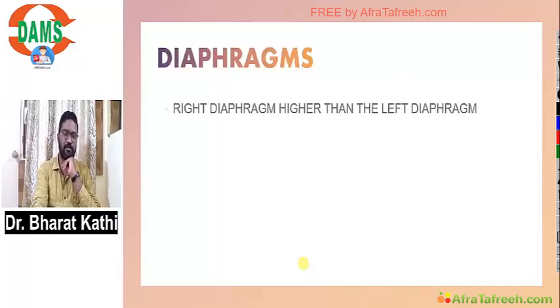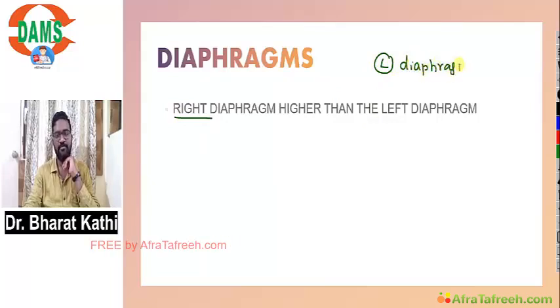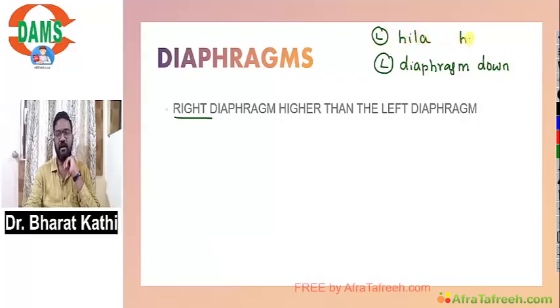Then coming to diaphragms, I told you the right diaphragm is higher than the left diaphragm. So left diaphragm or left dome is lower, whereas left hilum is higher.